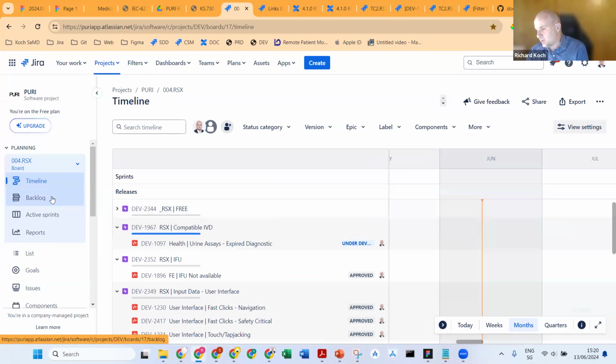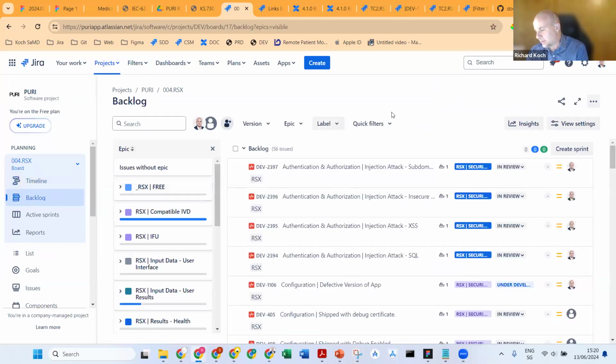And then you've got the timeline view, you've got your backlog view, as you can tell. And here is a similar principle. Again, I'm still working through these, where you can create sprints of different categories. And again, you're not coding here, so it's very different from an implementation sprint. It could be, okay, we have a sprint of tickets which are under review. Sprints are just a category of tickets, you could say, and a work status somehow. It's up to you how you want to do it, but there are different techniques you can use.